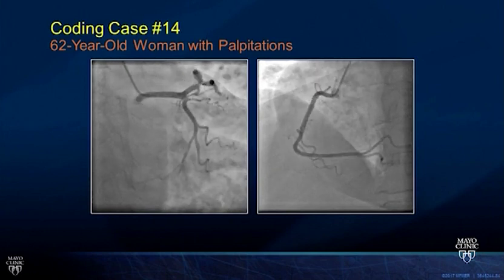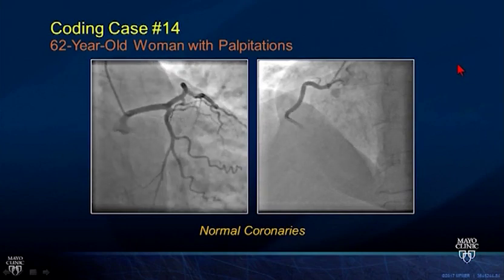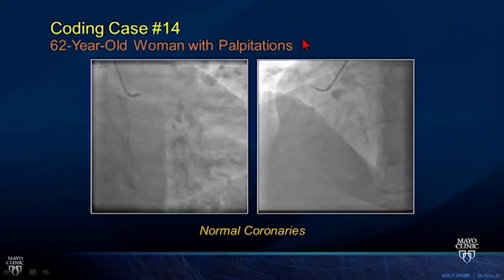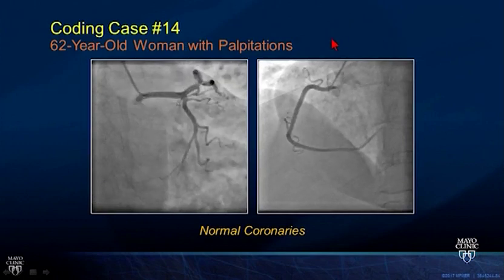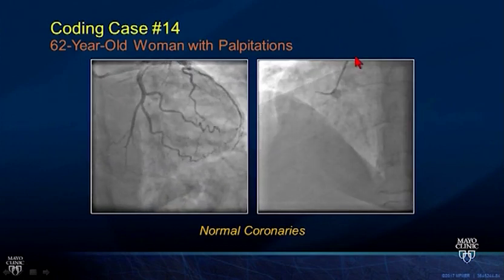All right, and this is the obligatory normal coronaries. So, good. You gotta keep that in mind. If you're looking and you're not seeing anything, the other thing is this patient has palpitations, so you may not be expecting to find coronary disease necessarily in this patient.